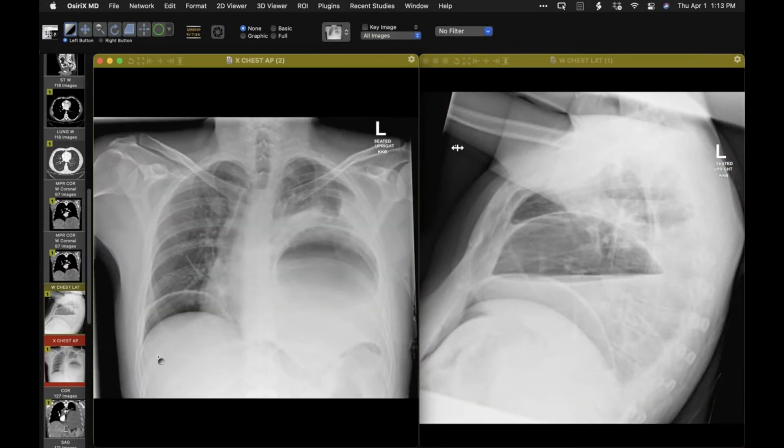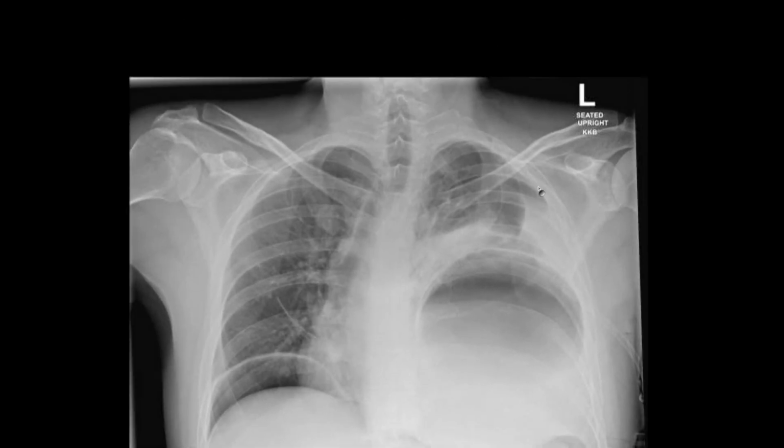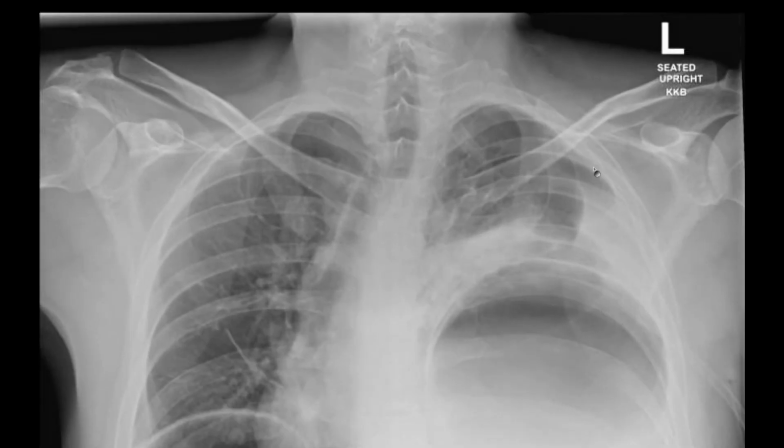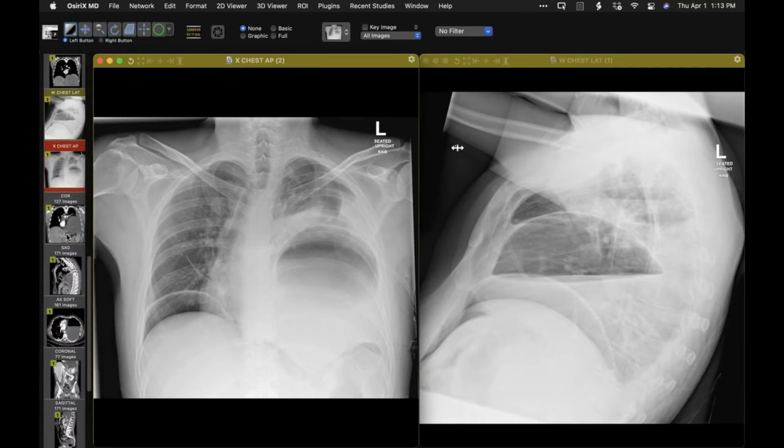So we have abdominal air, not surprisingly, but of course up here we have abnormal air. There is a fluid level. There is some fluid and air in the pleural space up here as well. So very concerning for what you'll see on the subsequently performed CT.